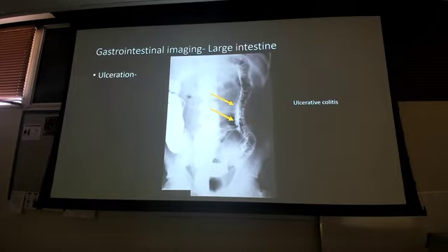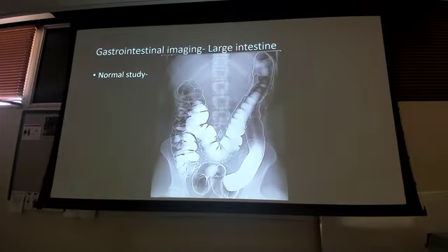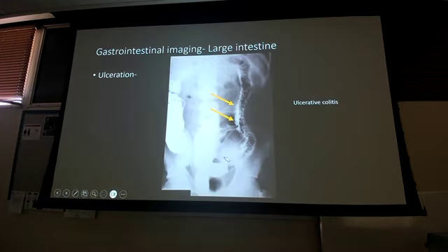Ulcerations, ulcerative colitis now, right? So there are Crohn's disease, small intestine, inflamed, string sign, ulcerative colitis, might have bloody diarrhea. And what you're looking at again, look at my smoothness here of my walls of my large intestine. And now look at kind of like the polka dotty kind of inflamed area there for the ulcerative colitis. Okay? So that's what's kind of showing you there. That bloody diarrhea will help you determine that along with the image.